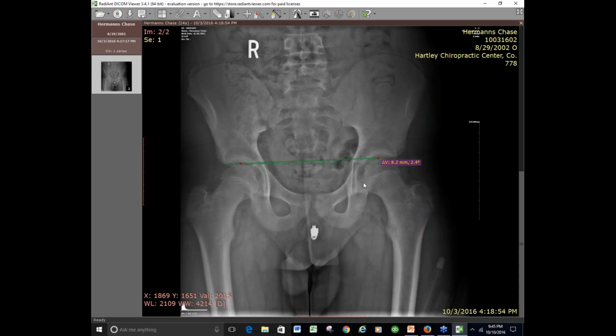You can set them up perfectly, but if the beam is too close to the film, it's going to amplify your distortions. Now, the nice thing with the new way that we learned it, let me click on this real fast: it does not change your hemipelvis measurement, because that's a relative measurement of 2 points, and if they're both amplified, they'll be amplified equally.